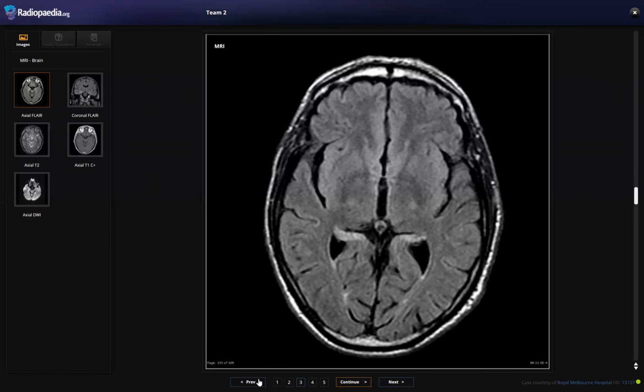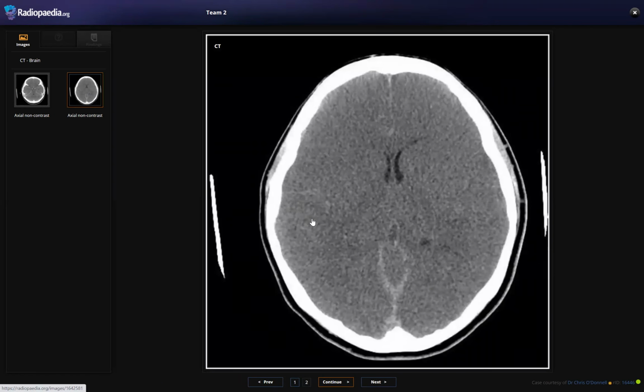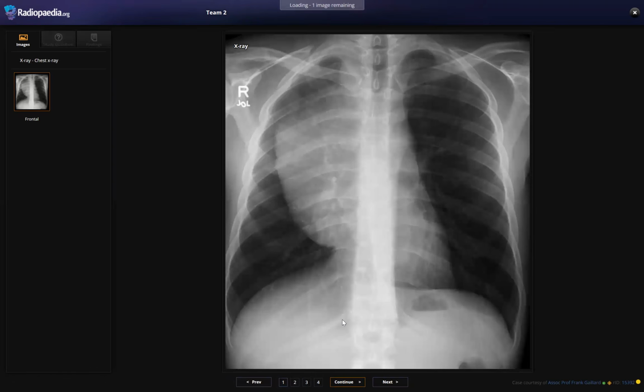Right. And this exactly, as you mentioned, is pseudosubarachnoid hemorrhage, and this is the basal cistern effaced with diffuse brain edema. Yes. Nothing to add. This just shows how to approach a mediastinal mass, the hilum overlay sign, and silhouetting of the right cardiac border. And it was anterior, yes? Yes. I put it only to say it is an anterior mediastinal mass. That is very good.